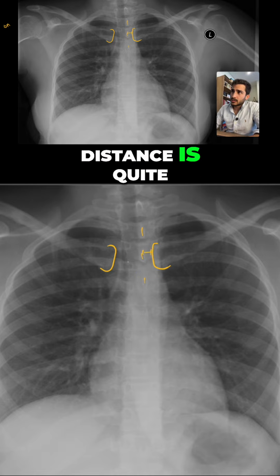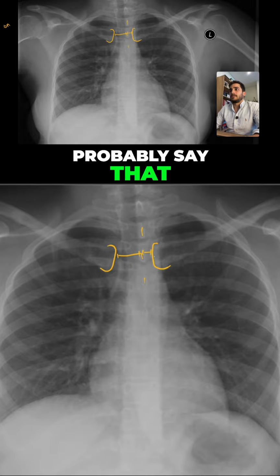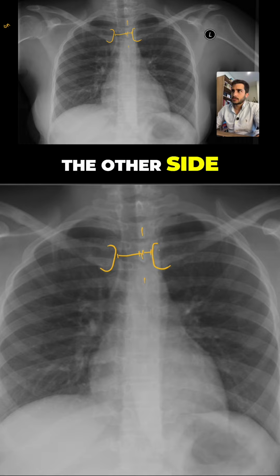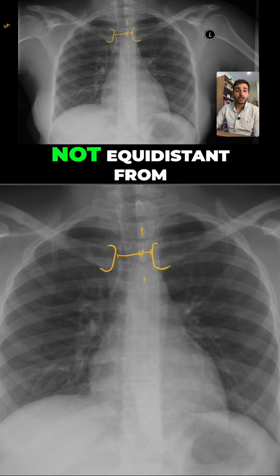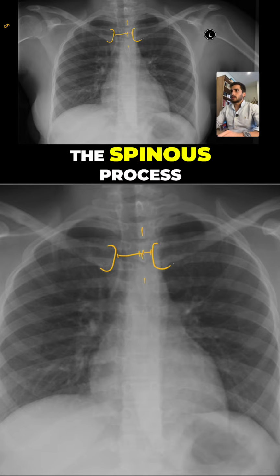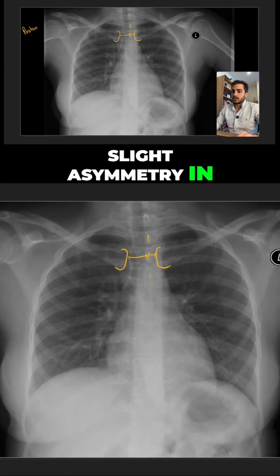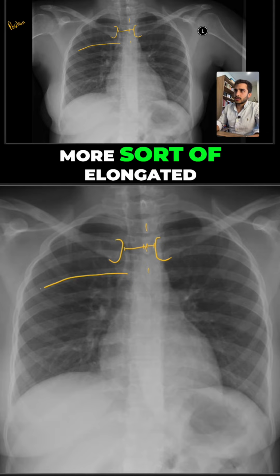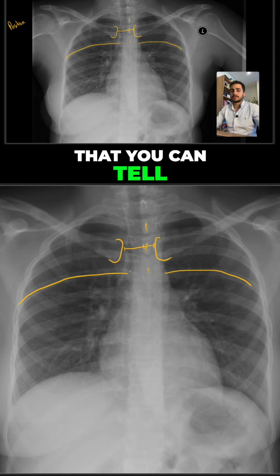See how this distance is quite small compared to this one. Okay, we can probably say that the patient's left shoulder was a little bit closer to the board compared to the other side. So a slight rotation because the medial ends of the clavicles are not equidistant from the spinous process. If you look at it overall, there is a slight asymmetry in terms of the positioning of the ribs as well. This one seems a little bit more sort of elongated compared to that side. That's another way that you can tell.